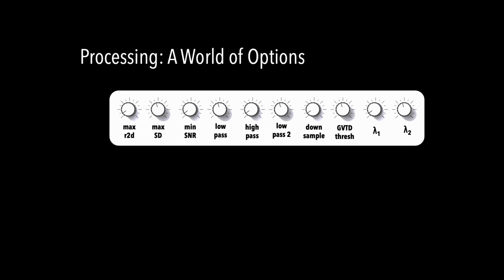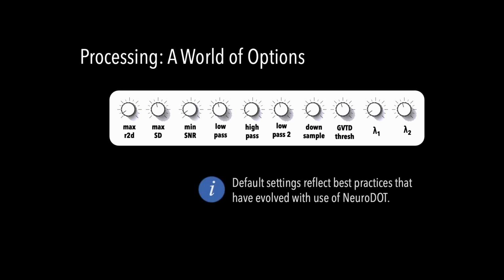Here, we only note the default settings reflect best practices that have been found to work well with typical high-density array data. As always, you may contact the development team with any questions regarding the use of NeuroDOT for your specific application.